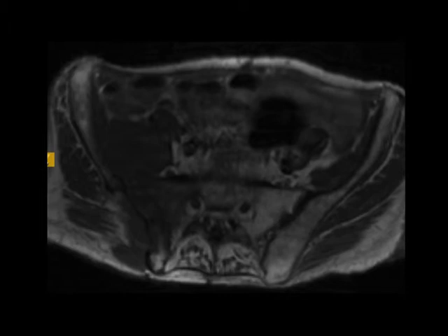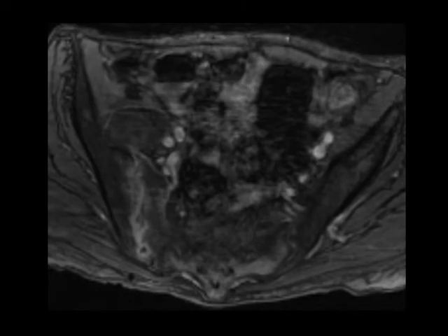So here's a patient who's presenting with right-sided pelvic pain. Now, obviously, there are a number of different diagnostic considerations you could have when evaluating these patients, but this patient had a fever, was doing very poorly, was very sick, and had an underlying history of HIV.